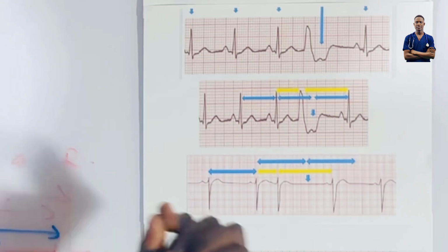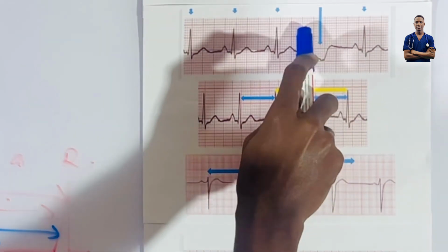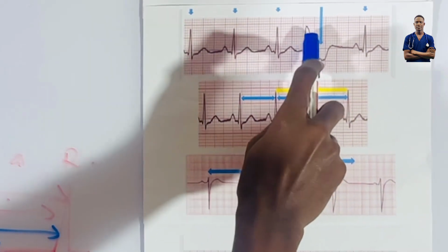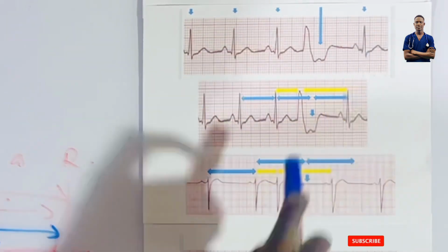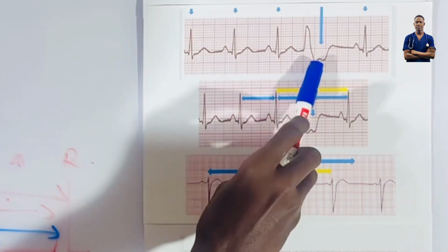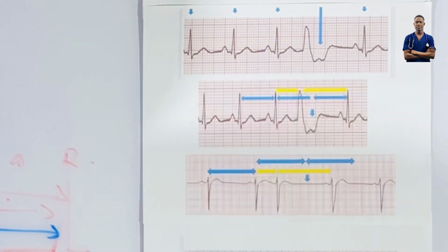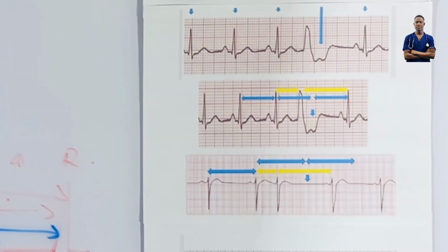Are you clear with it? It's very short. And then from the PVC to the next QRS complex, the distance between that part is very large. Do you understand? So this is actually serving as what? Our abnormal ventricular contraction, which is what? Early, generated without following what? The sinus contraction. Are you clear with it? The sinus rhythm.